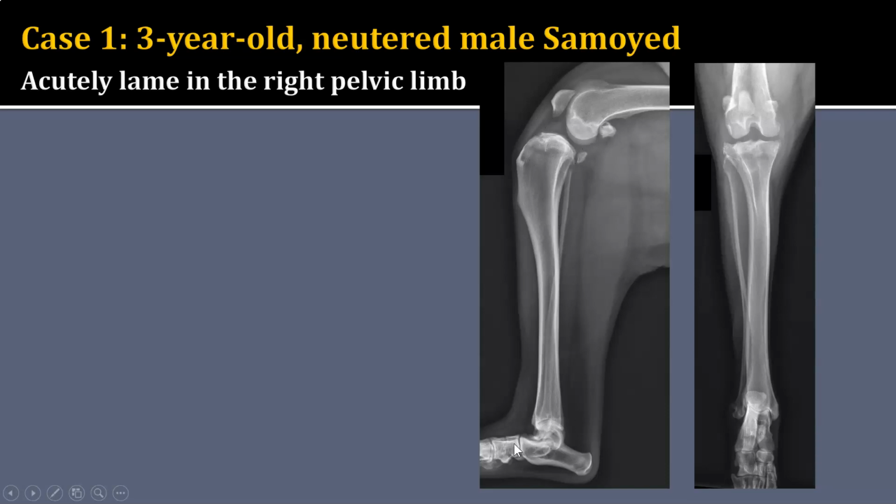Looking down the rest of the limb, there is appropriate alignment. Then I like to look at the soft tissues, and all of the soft tissues look okay with the exception of the fact that I see this soft tissue increased opacity and size associated with the stifle. The soft tissue here is too large. It's displacing that infrapatellar fat pad. It's kind of squishing it as well. And then back here on the caudal aspect, it's displacing this fascial plane. And so this is soft tissue swelling of the joint itself, or that intracapsular swelling, and I would call this a moderate amount. So moderate intracapsular stifle swelling.